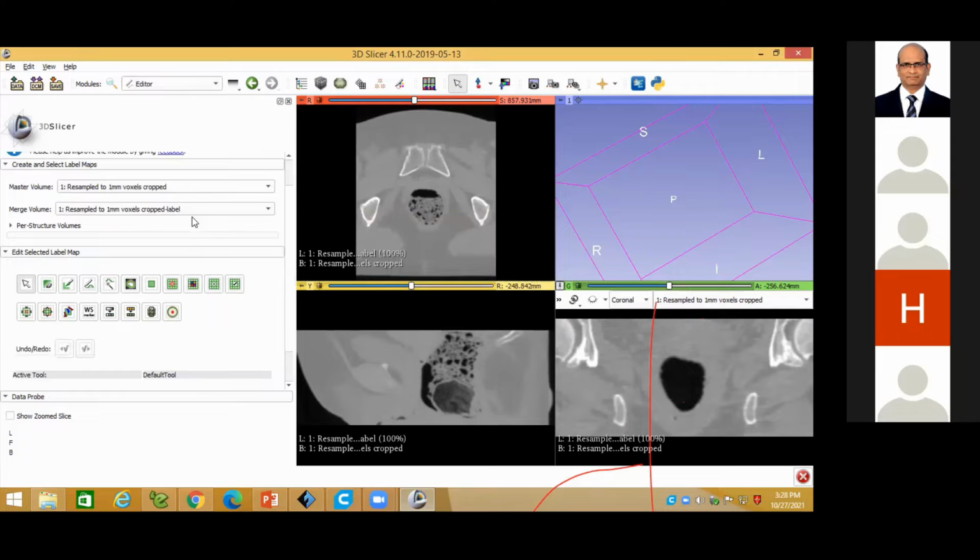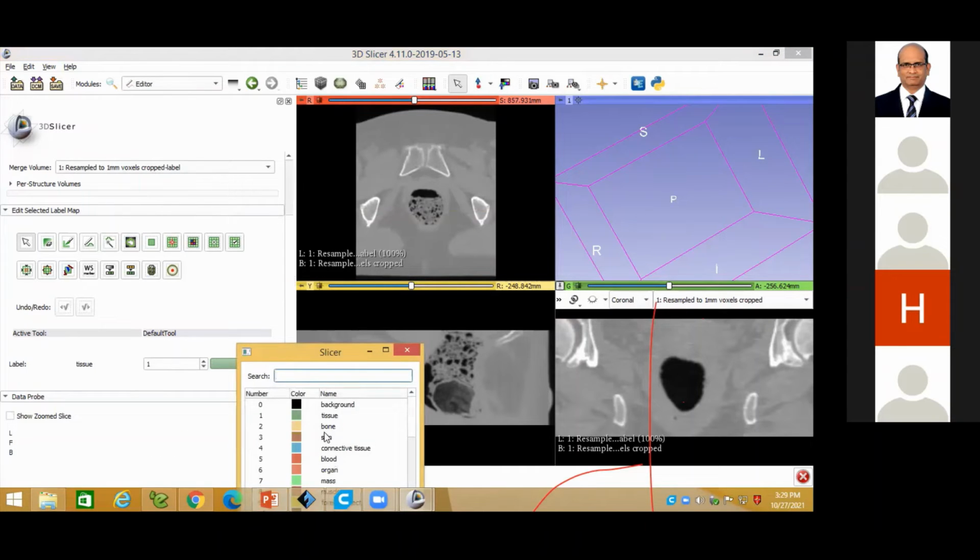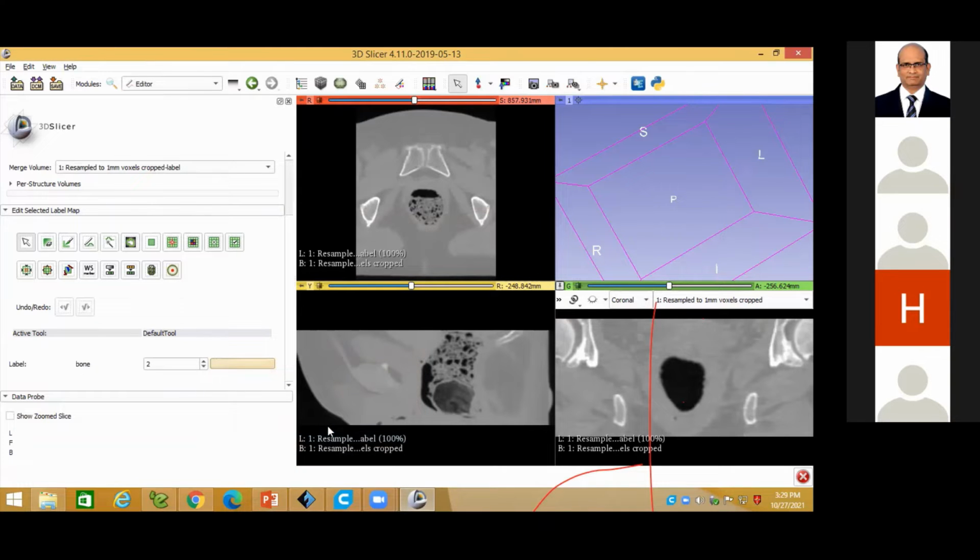Now you can see, okay, this is the now here. Now from here, we require the bone information. So here, whatever the information is required, once again, you have to choose, I want to require the bone. Just click the bone. Okay. Now here also, once again, you have to choose the threshold value. When we are choosing the threshold value, that region only we can extract.